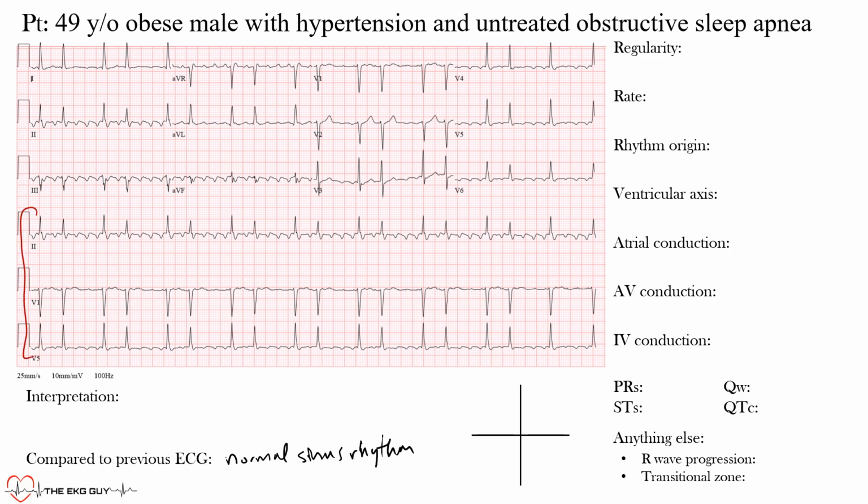So you can use any one of these, okay? And you can use any interval, but it's most often easy to find these big R waves that come here, these positive deflections, okay? So we'll use lead 2. And you want to look from one R wave to the next, okay? So here's the next one, so forth, okay? And all these between each are called R to R intervals. So from one R wave to the next is an R to R interval, from this to this, okay? And you're going to look throughout. And if you notice this, all right, this is actually an irregular rhythm, okay, meaning that the interval between these R waves is not the same, okay? So it's an irregular rhythm.